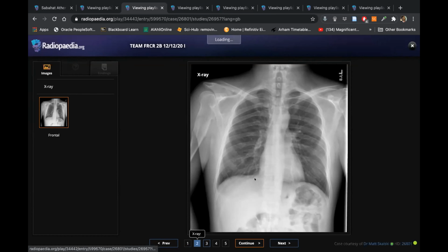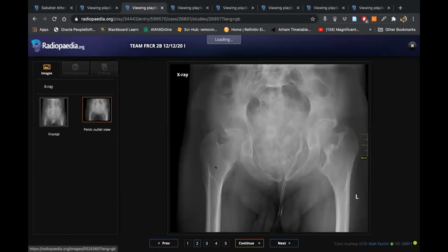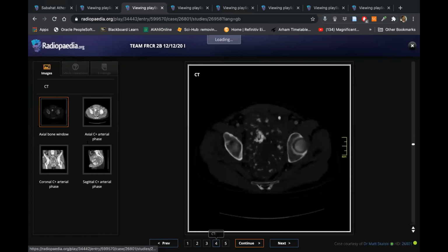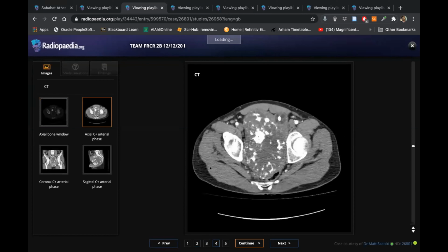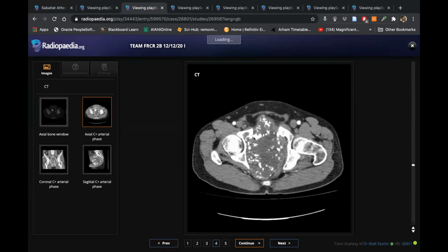When we come here, again, you correctly picked up. This is osteochondroma. This is osteochondroma. Okay. If I can show you, if I can convince you, even here, this neck is widened. This is osteochondroma, and this is malignant transformation of the osteochondroma, the chondrosarcoma. Okay. Flocculent ring and arc-like calcification. So here on the CT, what we were seeing was basically the malignant transformation of the osteochondroma.